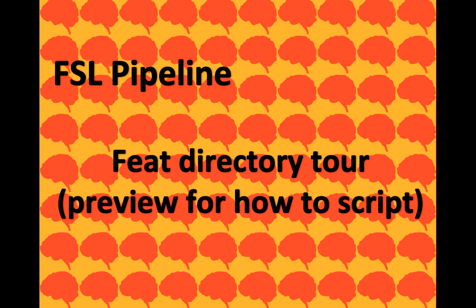The design.con is a text version of the contrast that you made. There's always this header information in both the design.con and the design.mat, which is the design matrix. I like to read these into MATLAB or R sometimes, and I simply tell it to skip the first lines. For the con, you'd have to skip 1, 2, 3, 4, 5, 6, 7, 8 lines, and then tell it to start reading, and you'll get the contrasts.